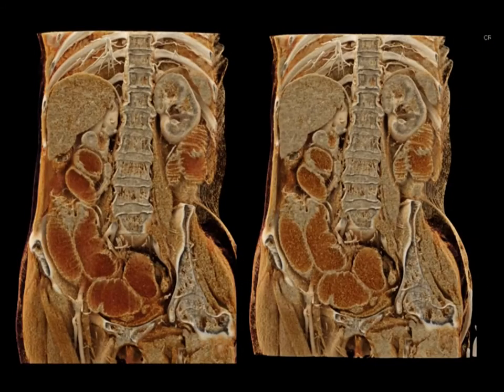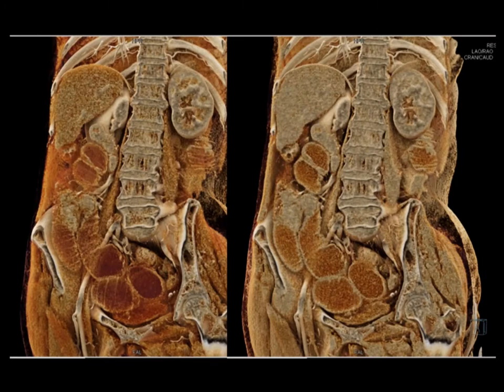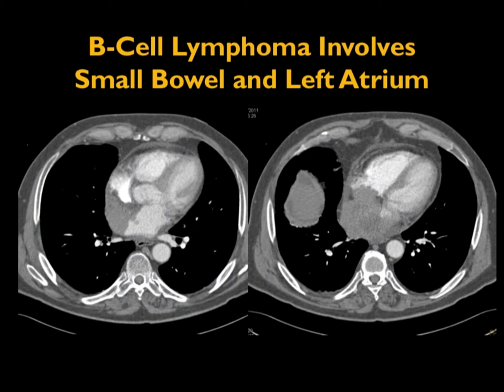And again, just looking at the value of the coronal view, looking at the ability to define transitions, the soft tissue mass, and again with cinematic rendering, look how nicely you see the rendering of the fluid in the bowel. Then you see the increased soft tissue density, which is the cause of the mass, very nicely seen on the sequence of images. I mentioned B-cell lymphoma.